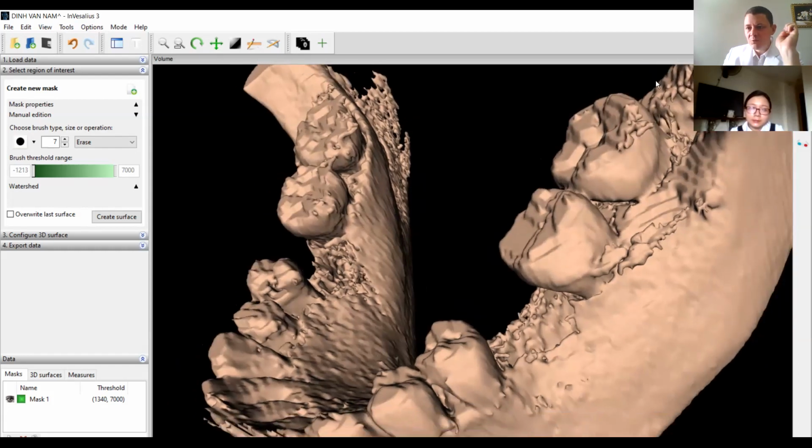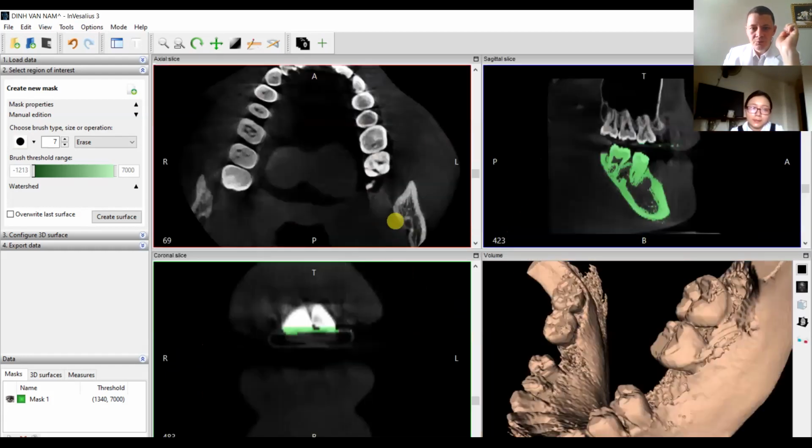So let's say you want to clean this, well, you go back to your original selection.